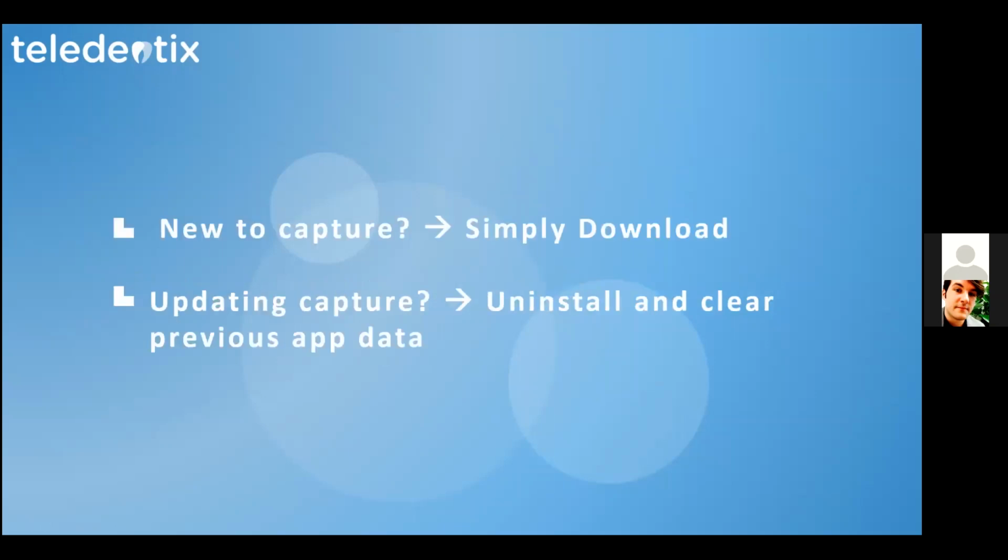Okay, so if you're new to Capture, you're simply going to download, and we'll walk through that in just a second here. Now, if you already have Capture on your computer or on a laptop that you use, excuse me there, guys. My audio had a little break there. Okay, so yeah, if you already have Capture, you're going to want to uninstall the current version and clear out the previous app data.